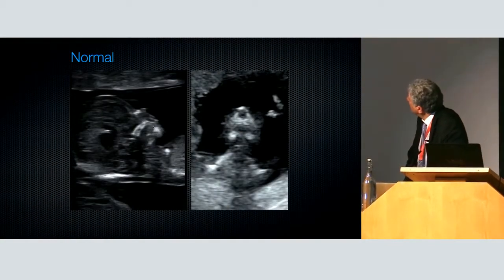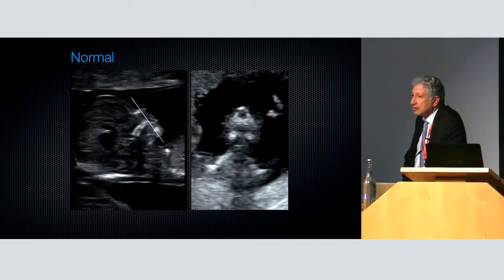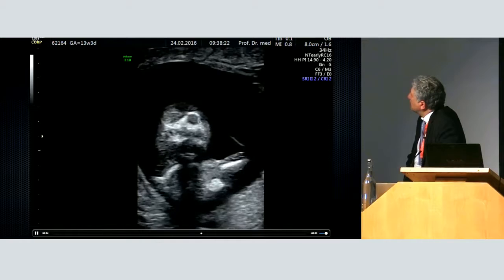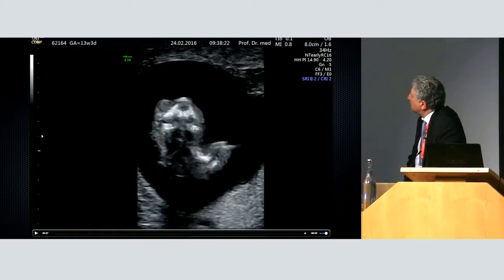So imagine now you have this nice profile, and you are cutting in this plane to see the nose and the upper maxilla. You are behind the tip of the mandible. So this is why you see the left and the right side of the mandible, and you see the normal gap between them. If you have retrognathia, this is the view. Look, now this is a video clip rotating from the anterior, and you see here 1, 2, and you see that underneath you have here a gap.